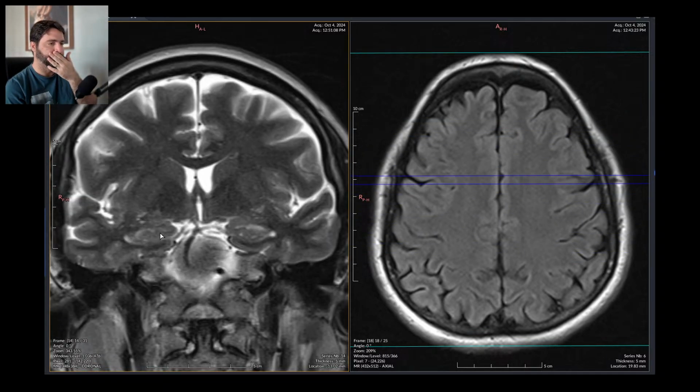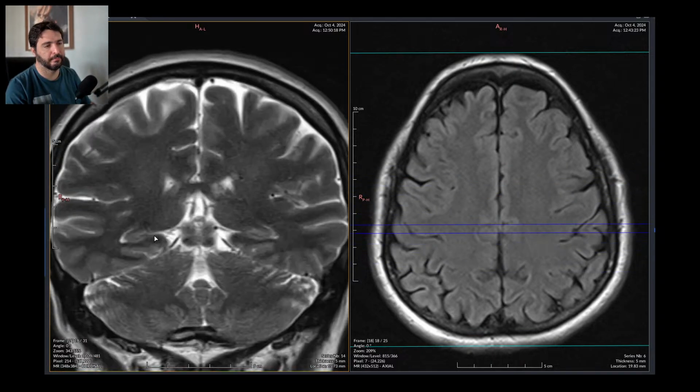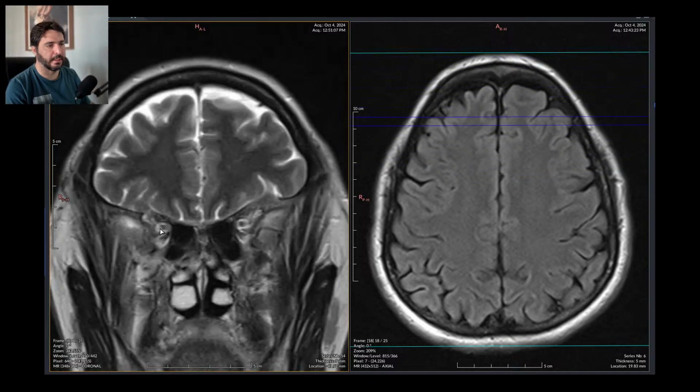To check for hippocampus anomalies. No hippocampal anything. So this is a normal MRI scan. I know it's not fun, but I'm not faking it. I'm reporting as I go, and you guys are here with me as we do it.